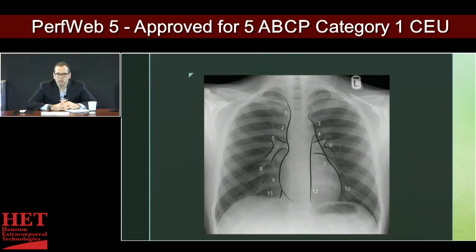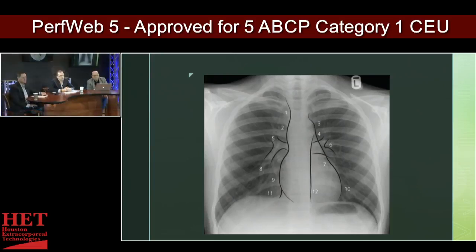Number seven is going to be essentially around the left ventricle. And that's the area when they talk about inside the box with the gunshot wound to the chest, etc. Right ventricle, left ventricle, those are the structures that can be injured. And I've seen it where they have a gunshot and you're going into the OR, put them on bypass to repair a cardiac injury, and you see the bullet sitting there posteriorly in that section. And so that can help determine where you want to start your inspection in the operating room.